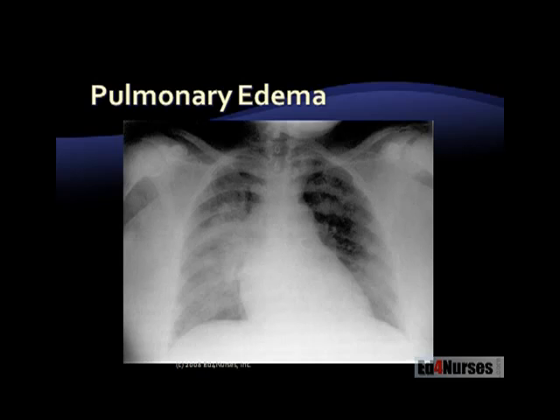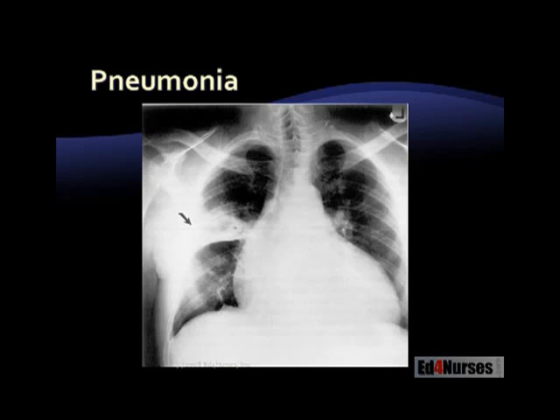Now, contrast what you're seeing here as an infiltrate. White, cloudy, fluffy looking, looks like you're looking through fog. Contrast that with this one. Now see that infiltrate that we have going on here? Again, we're going to go through our 5 steps. Assess for lung expansion. The lungs are fully expanded. See that nice diaphragmatic arch? You see it very well on the right. Nice costophrenic angles. The lung is fully expanded.